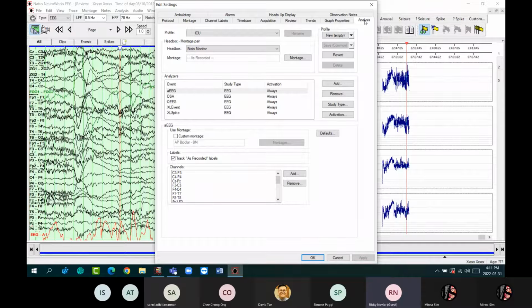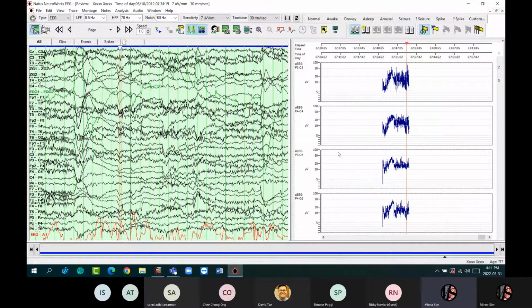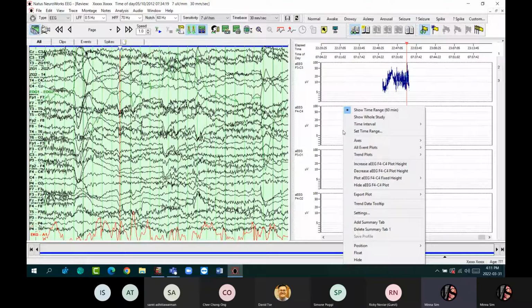Can you show us, let's say you are the doctor, how to read the result from the recorded session using the trend? If you want to export the trend to the report, you can right click on the trend window and do export.